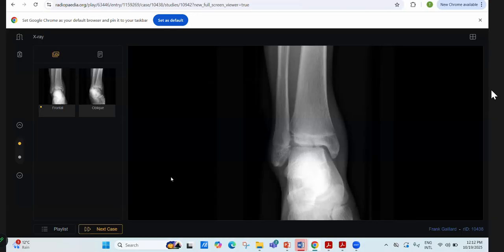Young patient with recurrent infection, cystic changes, pneumothorax, so likely cystic fibrosis, and I would further evaluate with HRCT and relevant investigations for cystic fibrosis, such as a sweat test. Okay, this is the next case.